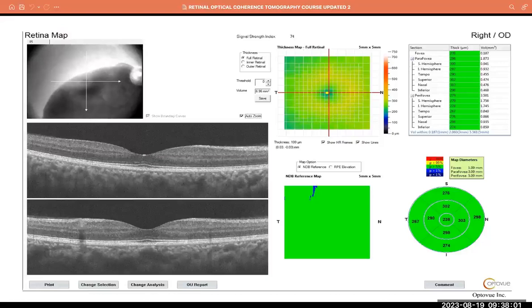If you look, there are tiny numbers beside it. So if the thickness is increasing, the color will change. If this retina was thick, everything would actually appear to be in white. White is like the thickest the machine can color code. So that's up there.